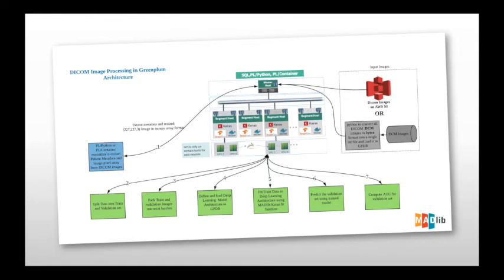So this third step takes all of the DICOM image data and distributes it only to those two segment hosts where GPUs are attached. Let's say if you have GPUs on all four segment servers, then it will equally distribute the data across all four segment hosts. So that packing and distribution of images is done in step 3.